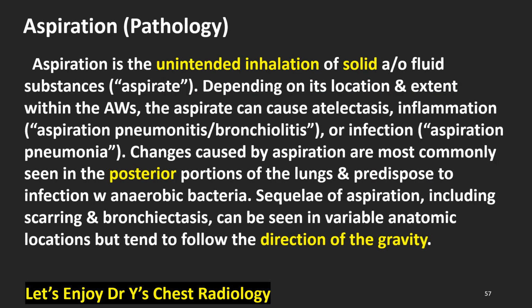Aspiration pathology. Aspiration is the unintended inhalation of solid and/or fluid substances, aspirate. Depending on its location and extent within the airways, the aspirate can cause atelectasis, inflammation, aspiration pneumonitis, bronchiolitis, or infection, aspiration pneumonia. Changes caused by aspiration are most commonly seen in the posterior portions of the lungs and are predisposed to infection with anaerobic bacteria. Sequelae of aspiration, including scarring and bronchiectasis, can be seen in variable anatomic locations but tend to follow the direction of gravity.